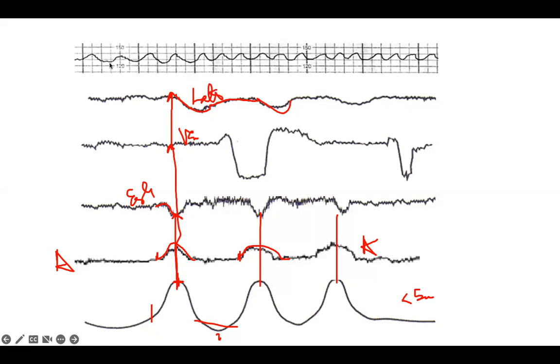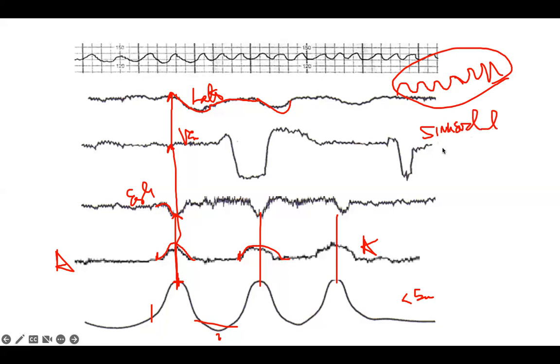And the top one, you see, it looks sinusoidal, multiple contractions, sinusoidal shape. The fetal heart rate looks sinusoidal, like that. Okay, unlike this wavy variability, this one has no variability. It's like sinusoidal. This is dangerous. Okay, when they give you this, you spell it like that: s-i-n-u-s-o-i-d-a-l waveform. When you see this, this is severe anemia, fetal anemia.